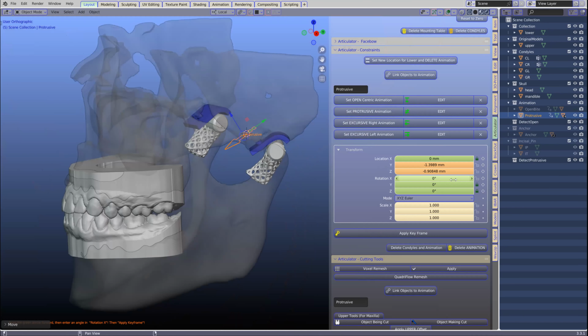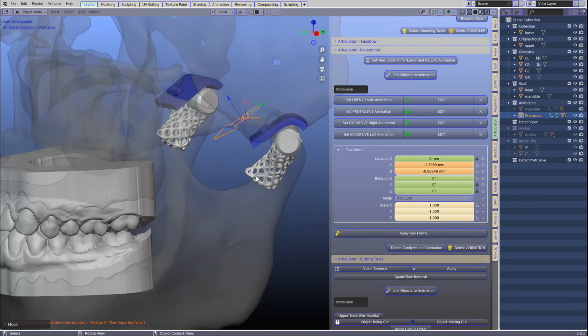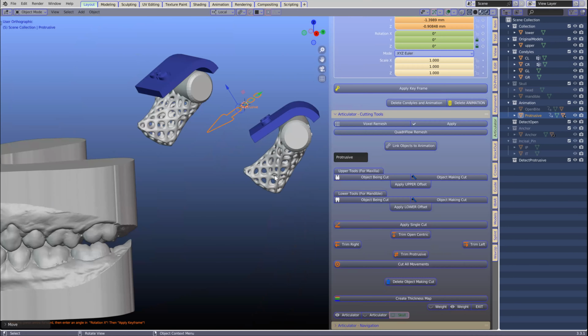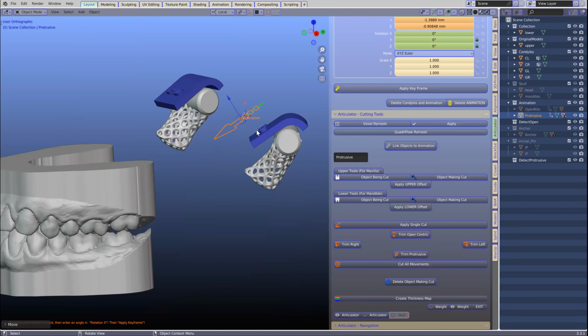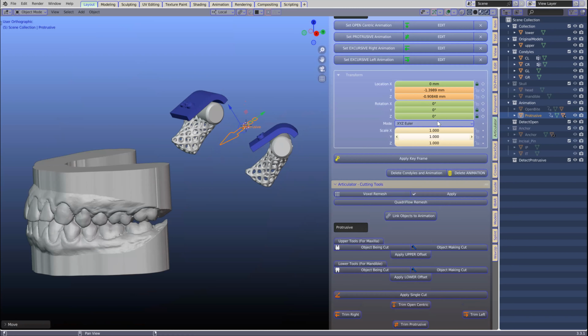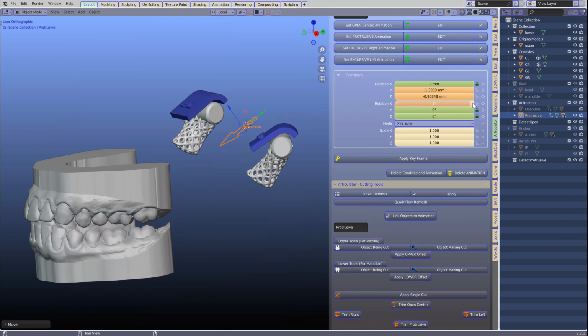The way my mentor says, you can think of it as moving along the hypotenuse, because it's a right triangle. Correct. So what we've done is we've moved it down the condyles, down the eminence, but we haven't opened it yet, which means we still have to open it up. So we're going to rotate it here. And you said by 3 millimeters. So again, 3 down, 1.75.